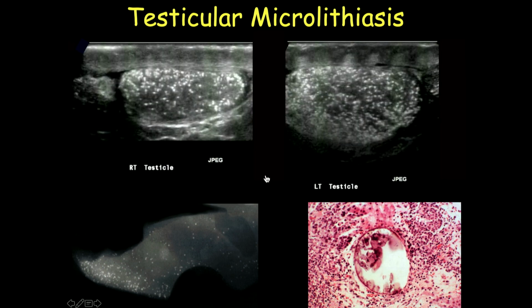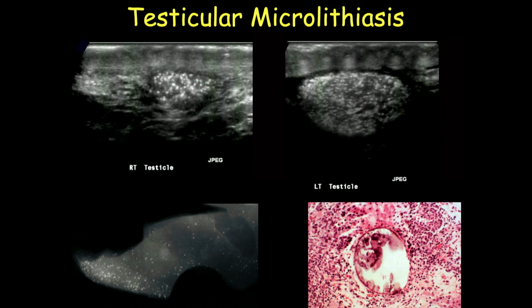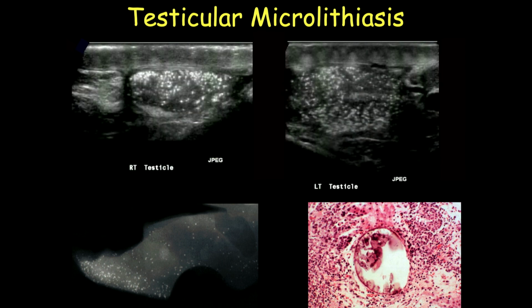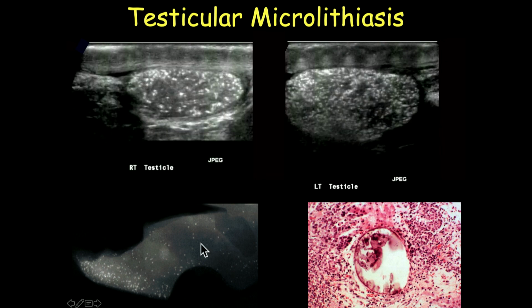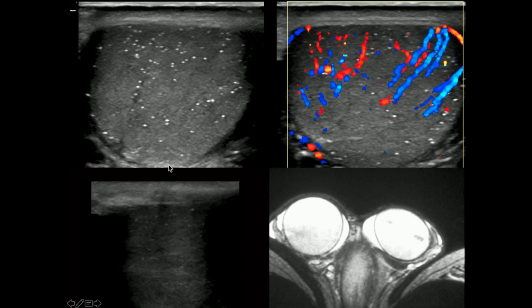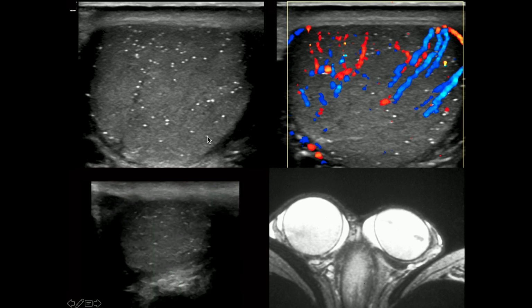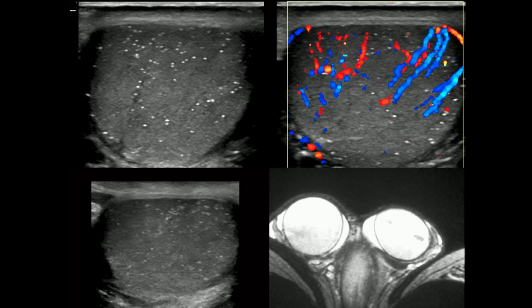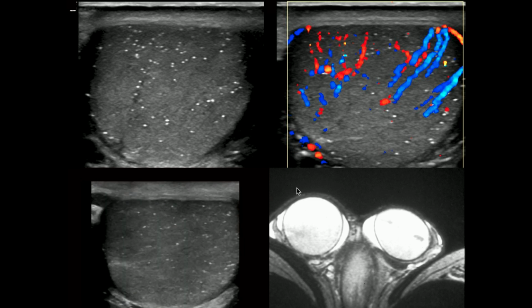And then the last thing we'll talk about is testicular microlithiasis. Fortunately, the literature has converged in the last 20 years, so I think we finally have an answer after all the contention. This is the most florid case I've ever seen. We actually got a radiograph of it. This one, remember, classic is 5 or more on one image, so these are obvious. This guy was the #1 plaintiff's attorney in town, made his life suing doctors, so the urologist went ballistic on this one. They ordered every tumor marker known to man and got an MR.